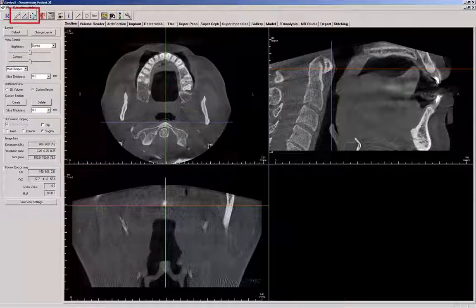The third measurement tool will calculate the surface area of a slice. After selecting this tool, click multiple points along the boundary of the desired area. Double mouse click or right click to end the measurement. The area will be displayed in millimeters squared.